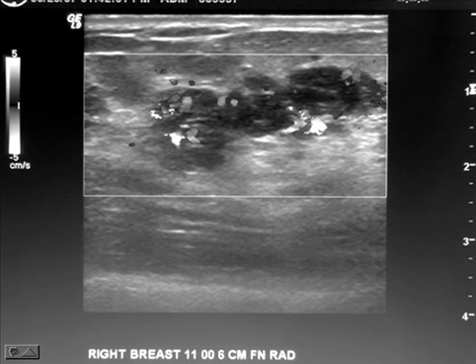In this case, the patient did report to us that she had redness and tenderness and actually pain over this mass, and that this was in the very same location where she'd had an abscess before. And when we put a needle in this mass, most of this actually did aspirate as thick kind of pus, and this proved to be an abscess. So even using ultrasound characteristics, sometimes you have to go further with a biopsy to prove what type of solid mass or what type of suspicious mass it is.